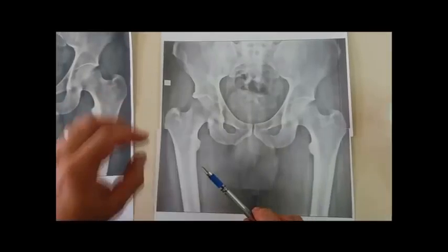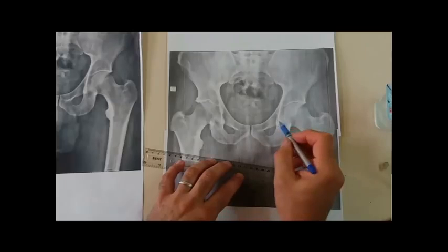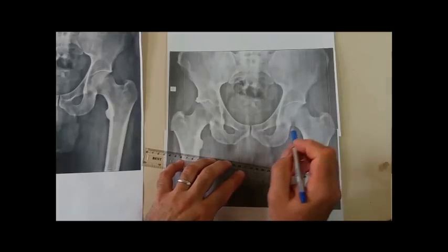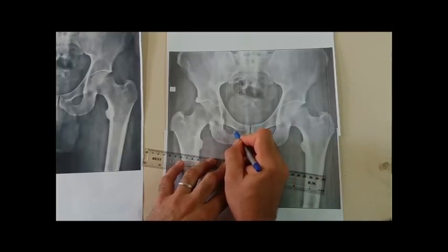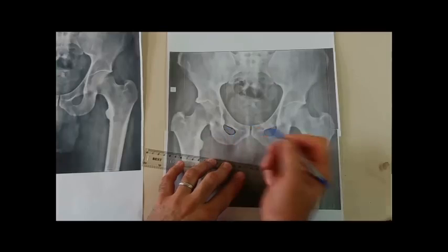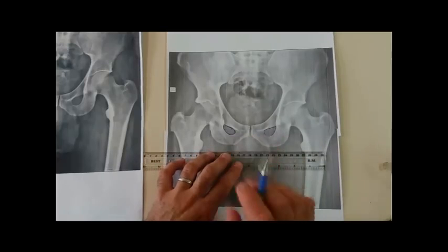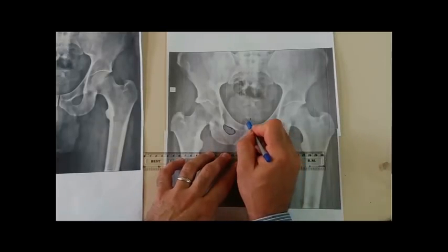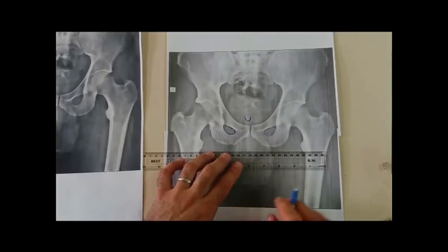To start with, I will check that the pelvic X-ray is adequate. This can be verified by the following items. First, both obturator foramina should be symmetrical, this one and that one. If these 2 foramina are not symmetrical, this means that the pelvis was oblique or other than a true AP pelvis. This is the first point. The second point is that the tip of the coccyx should lie above the superior edge of the symphysis pubis. This is the second point.